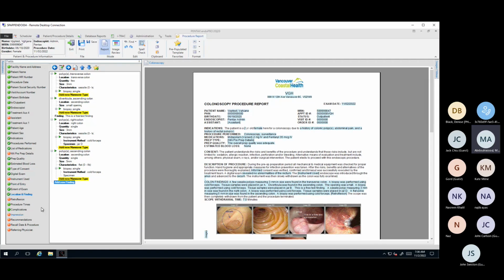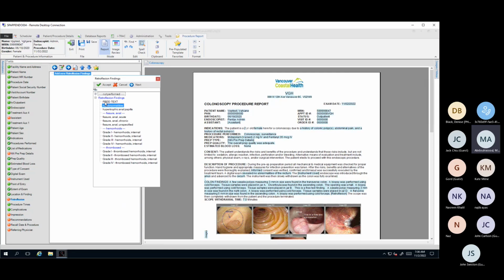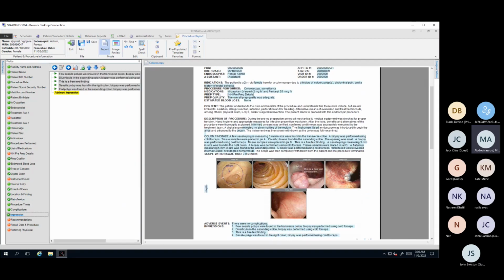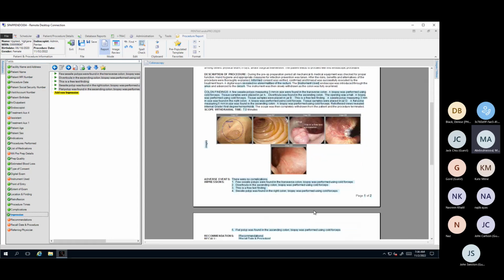Okay, so moving on from our location and findings over to our retroflexion. In this case, I'm going to mark retroflex findings as, let's say, grade 1 hemorrhoids. And then I'm going to move over to our impressions. You'll notice as soon as I clicked on impressions, it auto-populated our impressions. How that works is it takes our colon findings and uses that to automatically give us a summary of our findings.